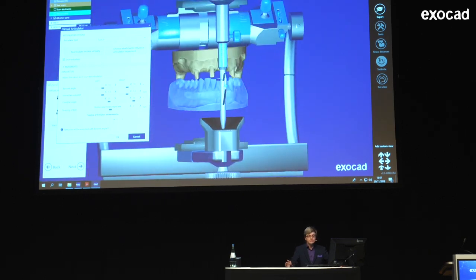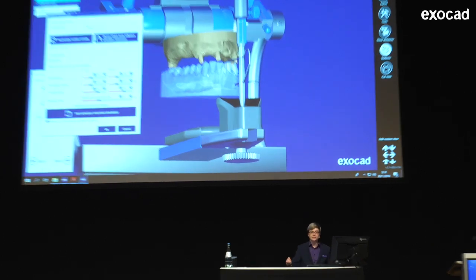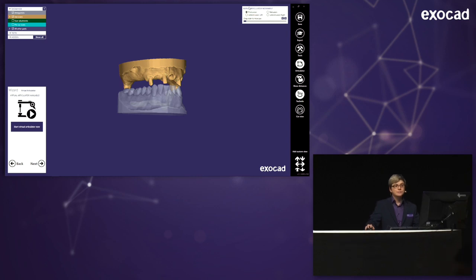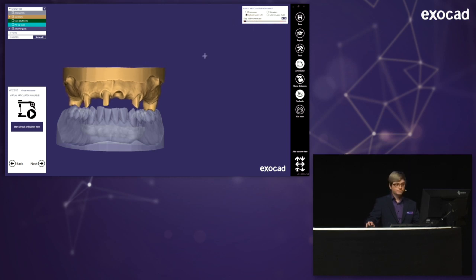While this calculates, you see the movement itself. We really recommend reusing the virtual articulator in every case where you have many teeth to replace, so the movement of the patient will be the same in the virtual world as in the real world as in your articulator in between. So the movement is calculated. Now up here, I have the repeat articulator movement dialog, where I can use the slider to reproduce all the directions of movement from the articulator again.